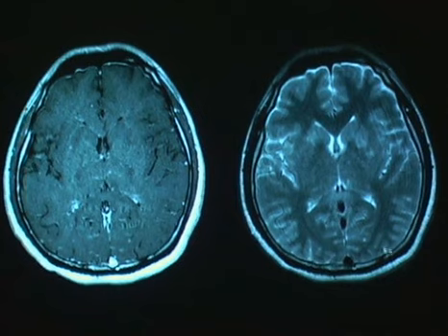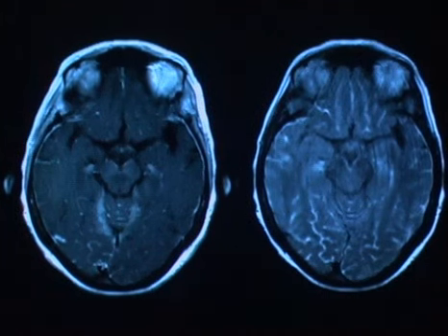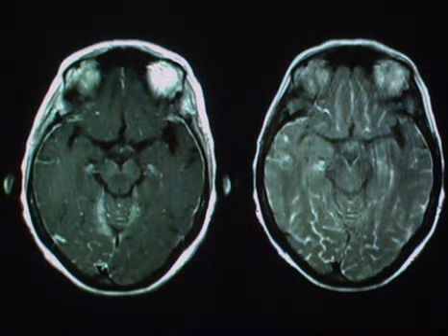And what we see in the post-contrast imaging is really not that much, but there was some slight increase in leptomeningeal enhancement in some of these posterior cerebral sulci. What we see on the T2 weighted imaging is also not too much, but what we do see is some signal abnormality within the left basal ganglia here. This was non-enhancing and was felt to represent some degree of infarct resulting from vasculitis involving perforator vessels due to basal meningitis.